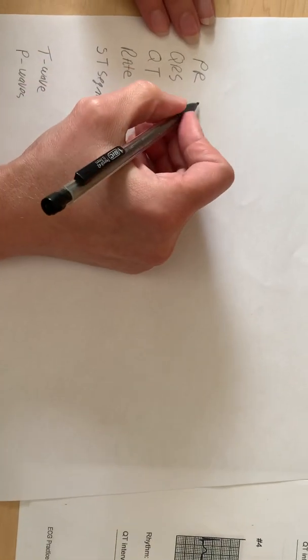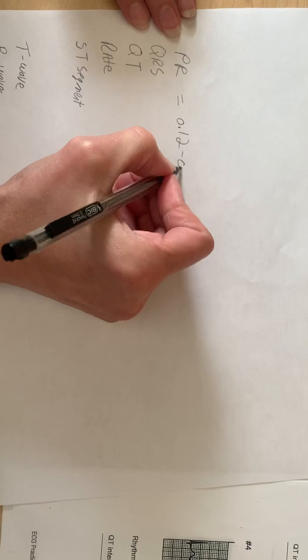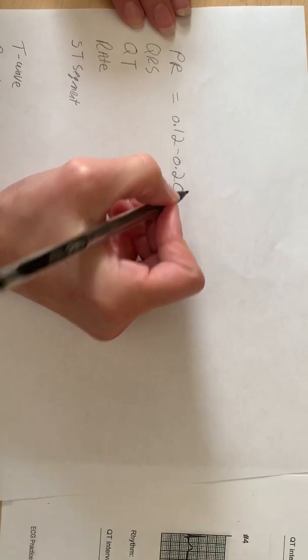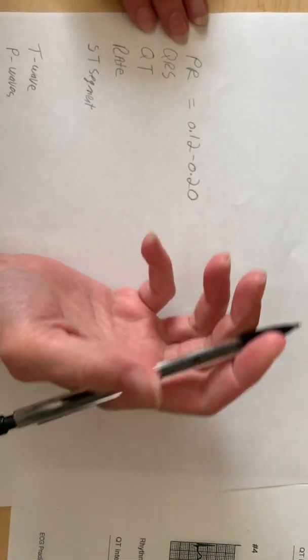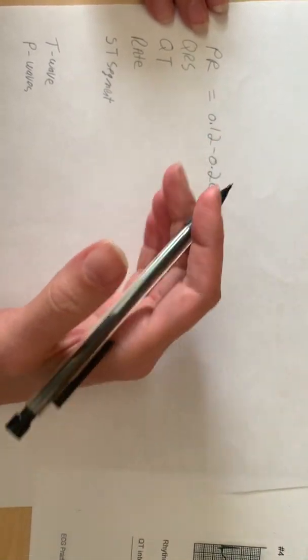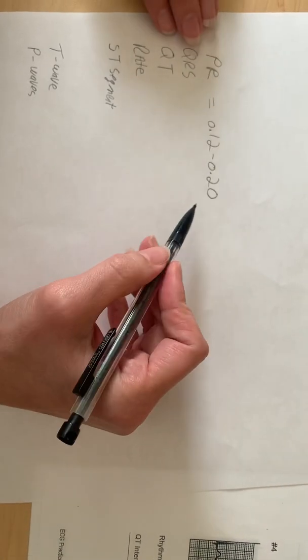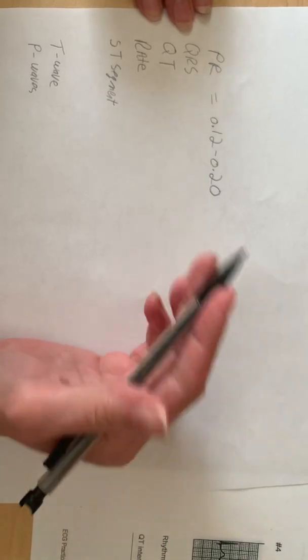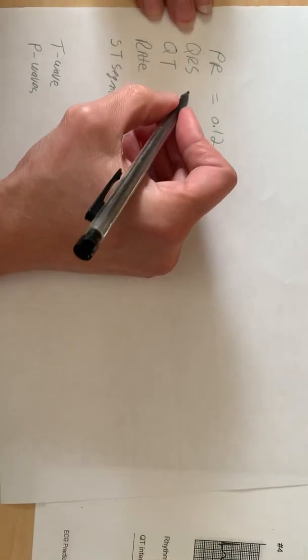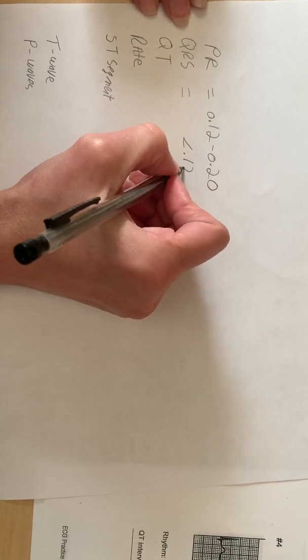So if we remember, a PR is meant to be 0.12 to 0.20. Now I know that in practice we try hard not to keep things in our heads, but there are certain things like normal vital signs that have to live in our heads, and if we're telenurses, normal measurements are one of the things that we need to keep in our head. We don't want to keep having to go back to reference. Now a QRS needs to be less than 0.12.